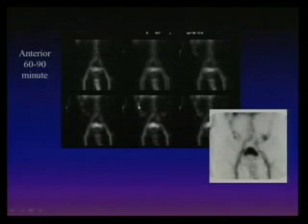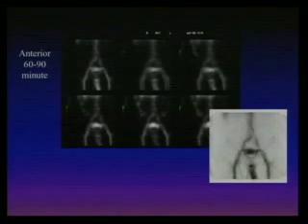This is the abdomen, right? Here. You think large bowel or small bowel? In the periphery. I'm going to go colon. Yeah, so that's a colon location.